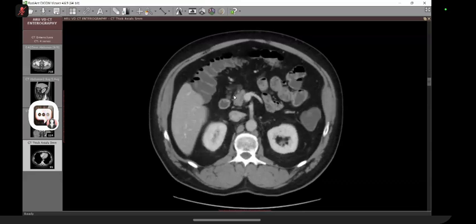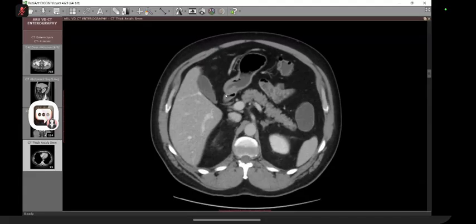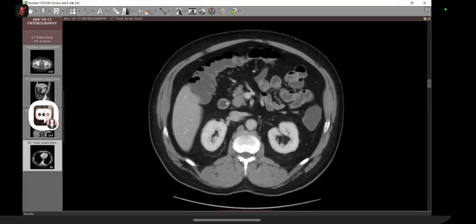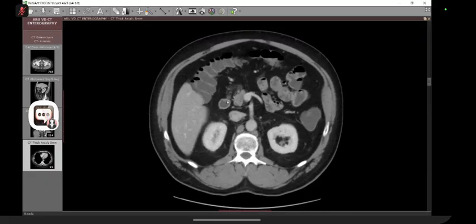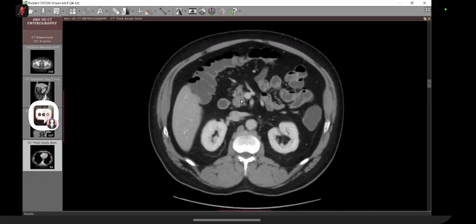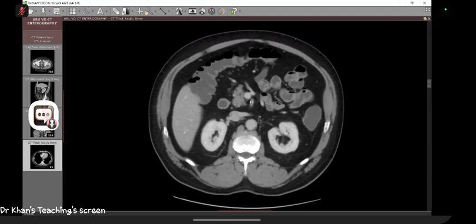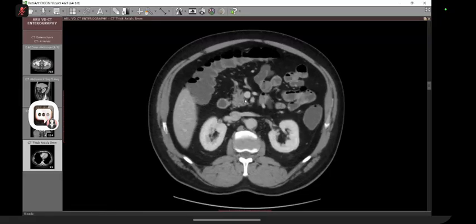And then as far as duodenum is concerned, the first part of duodenum is D1. And then we go into D2. D2, remember, is the descending portion. And this is where I was telling you that this is the most important part for the gastroenterologist. Why? Because Mr. Pancreas, this is the head of pancreas. So landmark is the pancreas. Head of pancreas is sitting next to the D2 segment. So this is the pancreas.